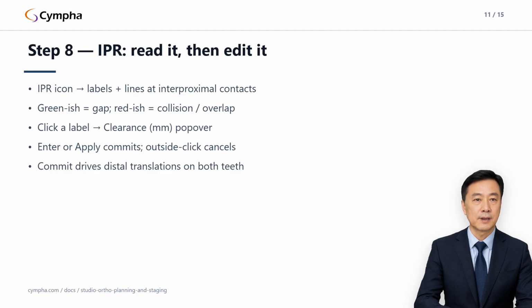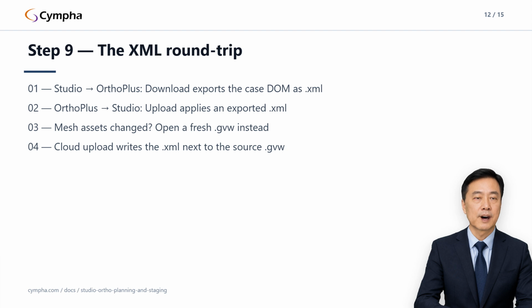One boundary: XML doesn't carry meshes, so if mesh assets changed in Ortho Plus, open a fresh case archive instead. And for signed-in users whose case came from a remote URL, the Cloud Up icon uploads the current XML right next to the source archive in the cloud. The case in Cympha picks it up on its next load. No download and re-upload dance.